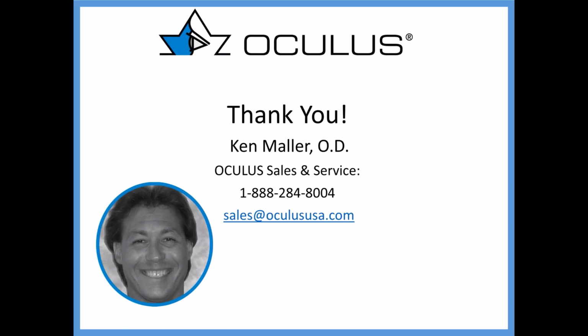So where I am now is typically about 425 to 450 microns of central clearance on my first Wave lens design. And what I do find is that that typically will leave the lens somewhere between 100 and 150 microns of settled location apically once it's actually on that eye.